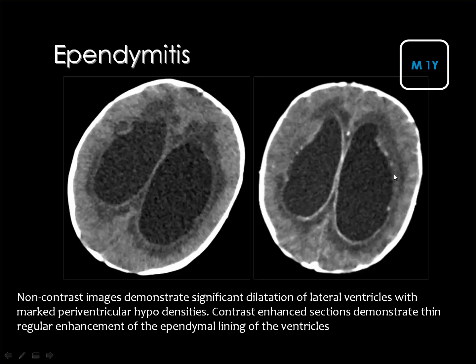And if you inject the contrast material, the wall will enhance with contrast material. And this is diagnostic of ependymitis or ventriculitis.